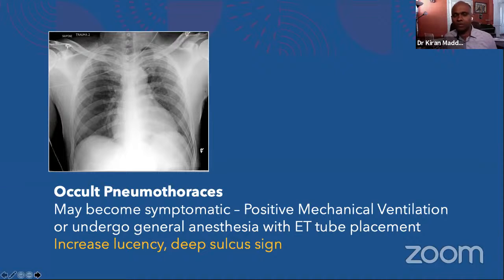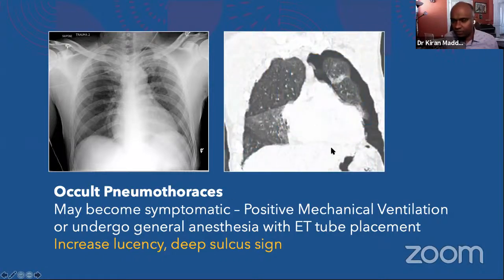But for example, imagine a patient driving at a speed of 30 to 40 miles per hour meeting with an accident, and a patient who is at 70 to 80 miles per hour, or 100 miles per hour. Imagine, make your story there. So something there, pneumothorax, very good. So this is a patient with whom we were not comfortable. Still, I see some apical lucency there, but I'm not sure what it is. So this patient went for a CT scan. And what is the diagnosis?